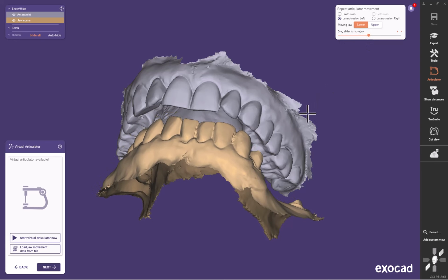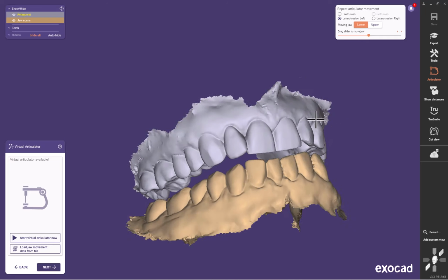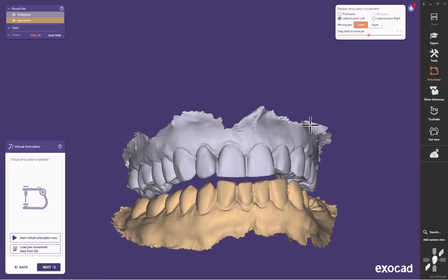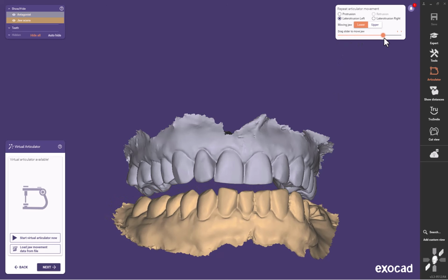Lateral, lateral. Here she's guiding on the opposite side, and I will go back and double check this in the mouth now that I see what's going on, because that's an extremely traumatic occlusion. That would certainly cause sore muscles, clenching, and she describes clenching and grinding. She knows she does all this type of stuff.